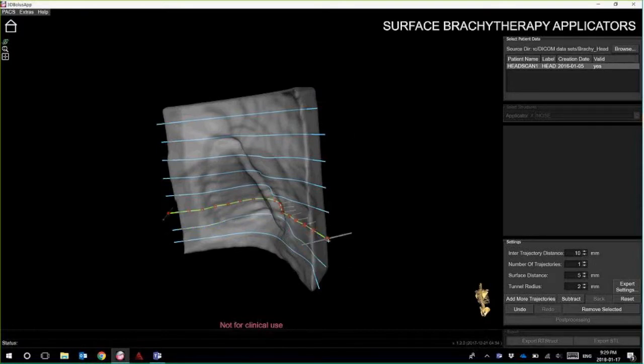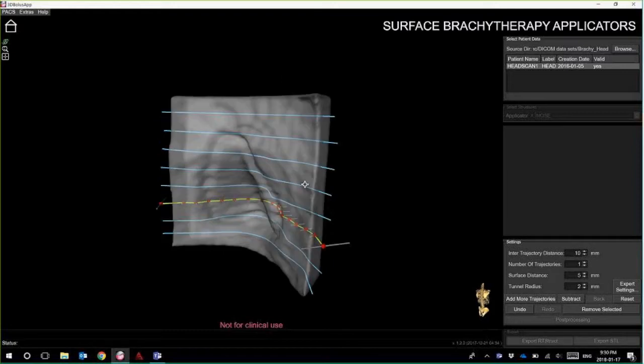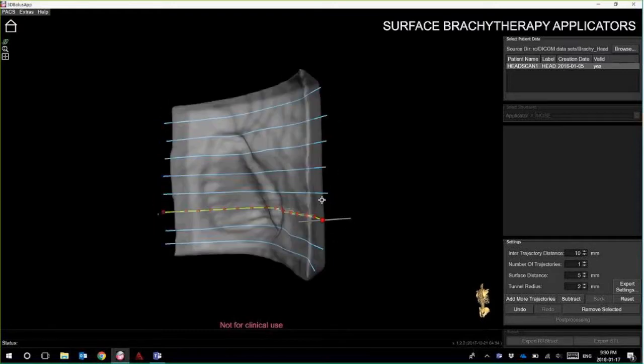the area along the nose, you want your trajectory line to be a little bit farther away. You can shift the entire line either closer to the patient or further away from the patient. But just do it one at a time, so that you don't have to adjust every trajectory line. Once you're happy wherever they are, as Mitch mentioned, it's a simple click and forget.